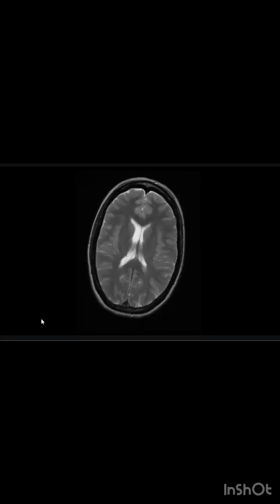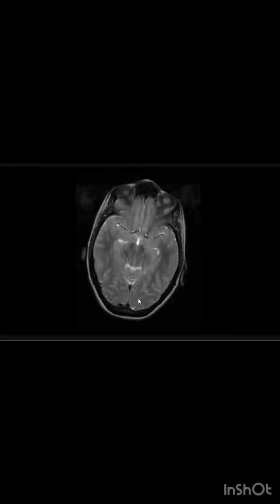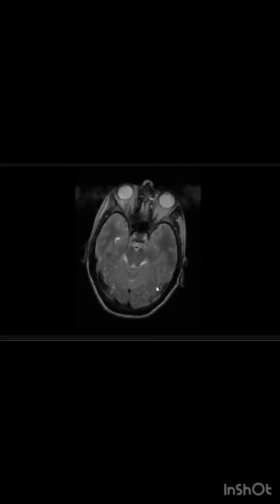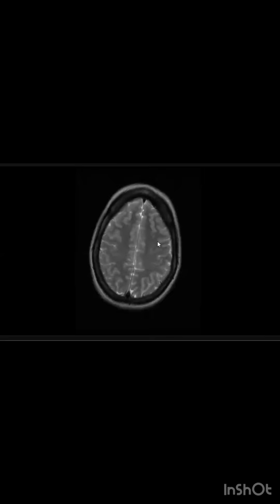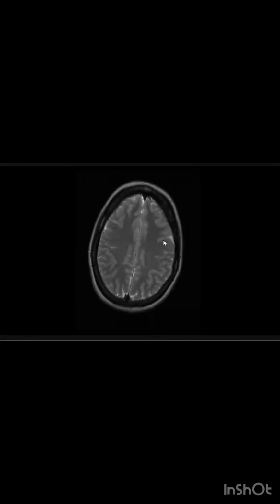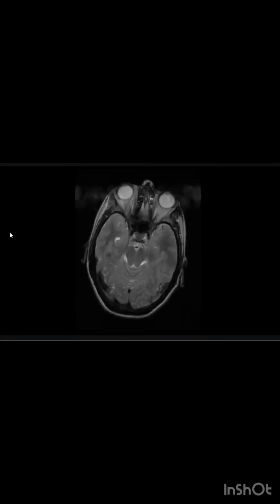The previous case diagnosis was complicated mastoiditis with multiple epidural abscesses and suspected sinus thrombosis. And here also, yes, the transverse sinus is also engorged. If you look here, there is some subdural collection. Okay, so you are suspecting.